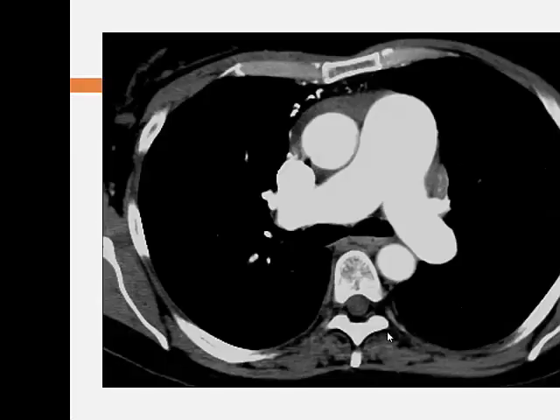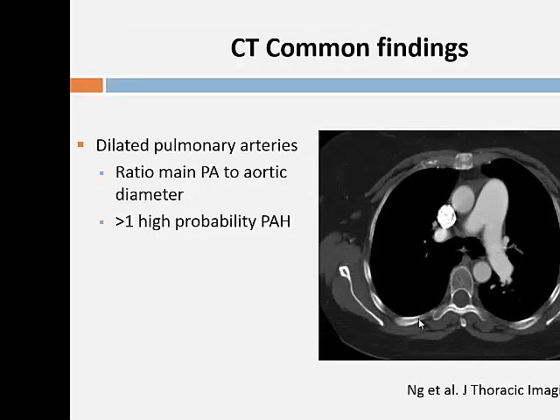How do you measure it? Just where you see it clearly, so there's no strict level, it's just off the axial image, so you just scroll up to where you see it nicely like that and just measure it AP. The key is just going AP.